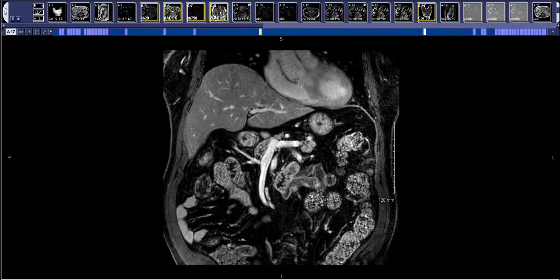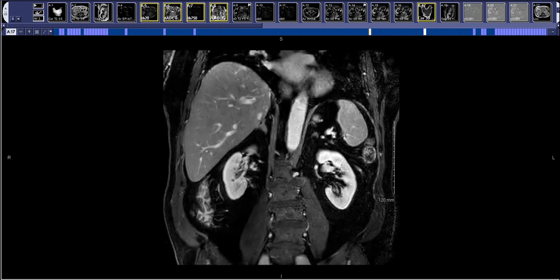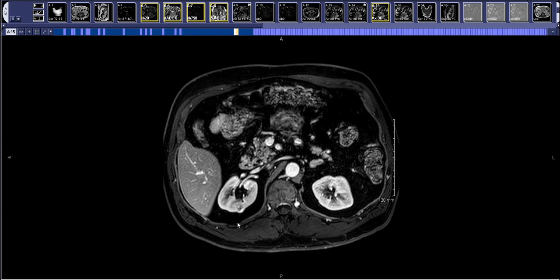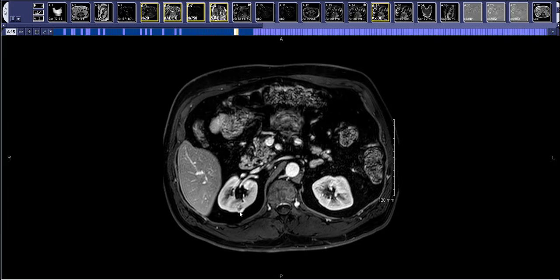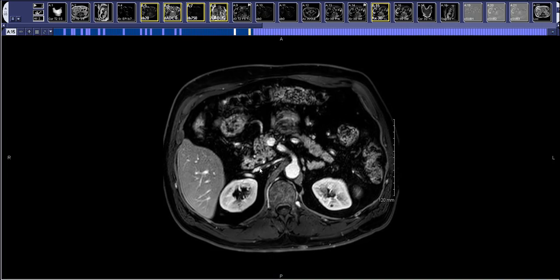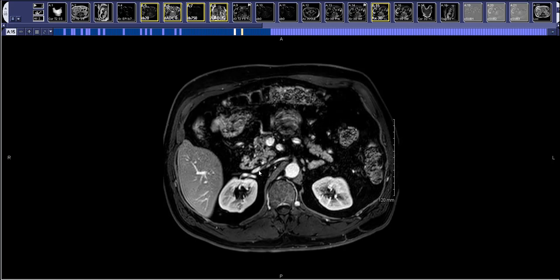Breast tissue, mesentery, lymph nodes. Renal cell also likes to invade the venous structures of the abdomen, so it's important to mention anything that may upstage a patient with renal cell carcinoma. In this case, this lesion is confined to the renal cortex, but you'd want to describe any extension beyond Gerota's fascia. Extension into the renal vein, into the IVC, and superiorly into the supradiaphragmatic IVC would also upstage them.